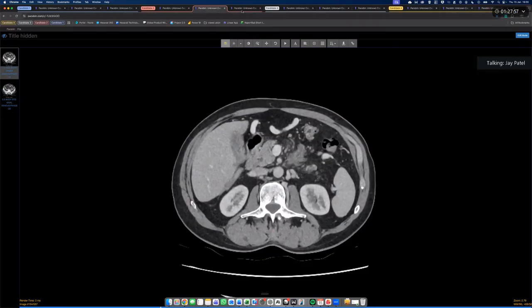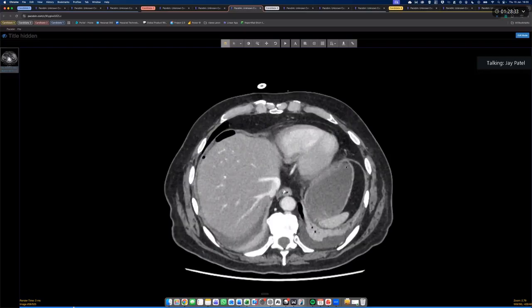Thank you. And in this case, if there was nothing else on the scan, you might make more of the gallbladder. Yes, sir. But the big striking abnormality here is the pancreas, right? Which you readily identified. So focus on the thing that's obvious and the bits around it. A concurrent gallbladder cancer with a pancreatic cancer, it's just too weird. So I wouldn't dismiss it, but I wouldn't focus on it. Okay.